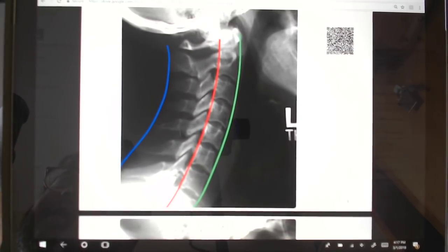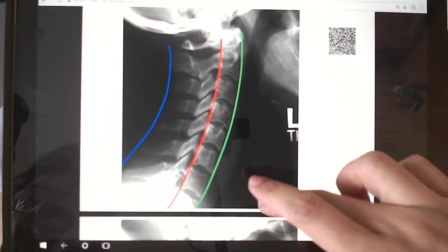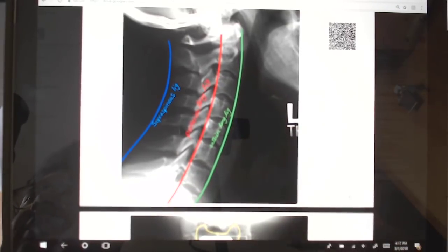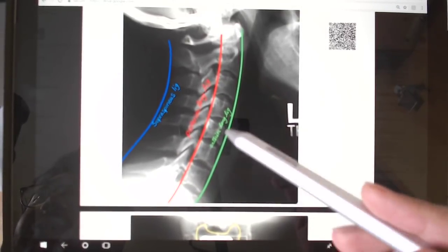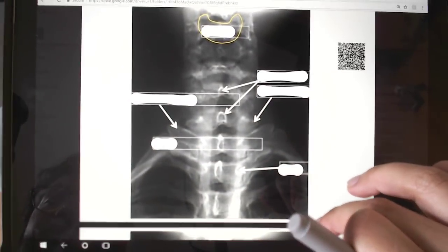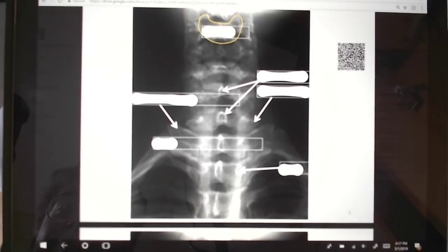Honestly, it's probably a good thing that this video is kind of blurry, because the scans you're going to get on the actual exam are going to be even worse. And they're not going to have the lines for you, so make sure you know how to read them. But you're really just looking for straight lines, and you'll get the hang of what everything is. Anything out of the ordinary, it should be symmetrical, and so on. You know what I mean?